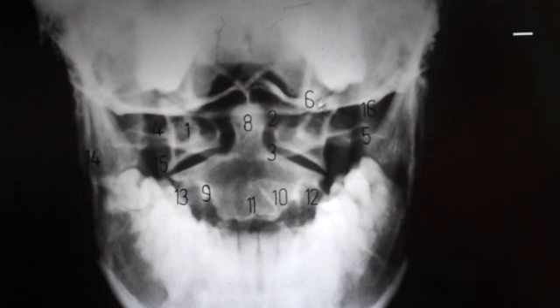Condyles fit really tight to the top of the lateral mass. Molars are usually outside beyond the lateral mass. So if you're looking at something rounded, you're not looking at the condyles. Again, condyles fit really tight to the top of the lateral mass.